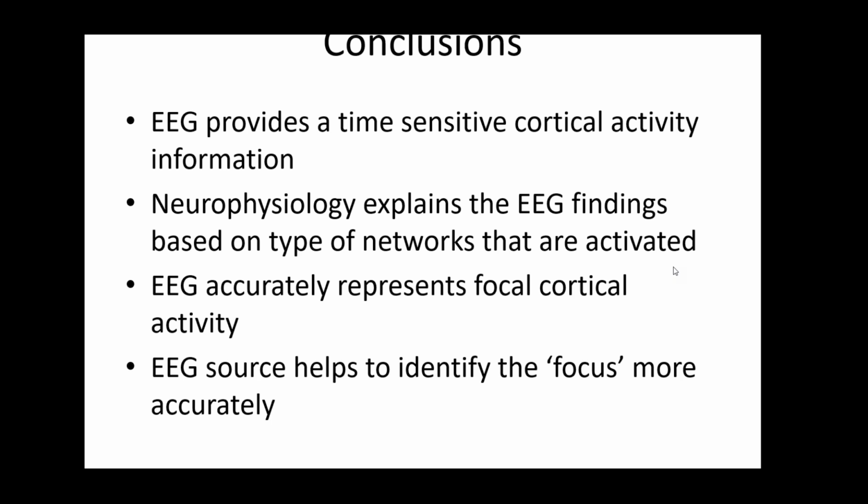The main thing to do in Curry for sLORETA is, first, you start with getting a good selection of the wave of the spike that you're going to source. Curry doesn't differentiate morphologies, it only goes by amplitude. So you have to make sure that you have a good signal to noise ratio before you do the current density sourcing.